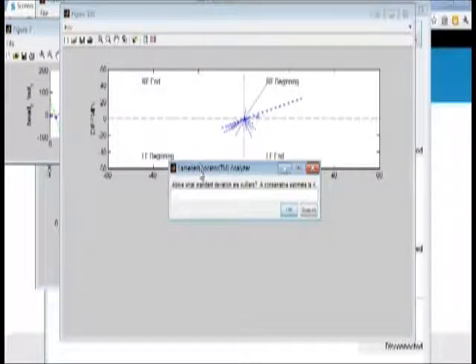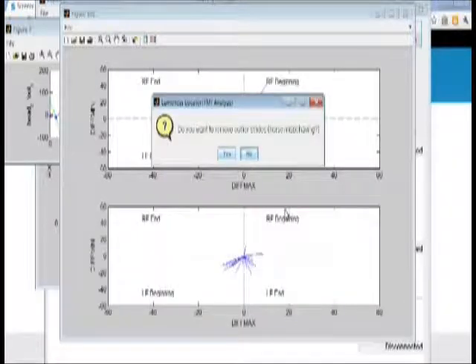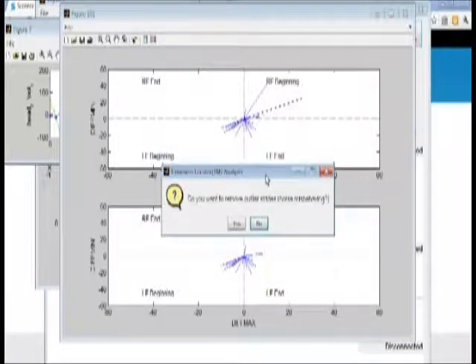In this particular case, we will enter a value of 2 so that any forelimb stride with a max diff head or min diff head greater than or less than the mean value plus or minus 2 standard deviations will be removed from use in lameness calculations. Entering 2 and selecting OK replots the default forelimb ray diagram on top and the new forelimb ray diagram with the outliers removed on the bottom. Notice that in the bottom forelimb ray diagram, the few rays in the upper right quadrant have been removed.